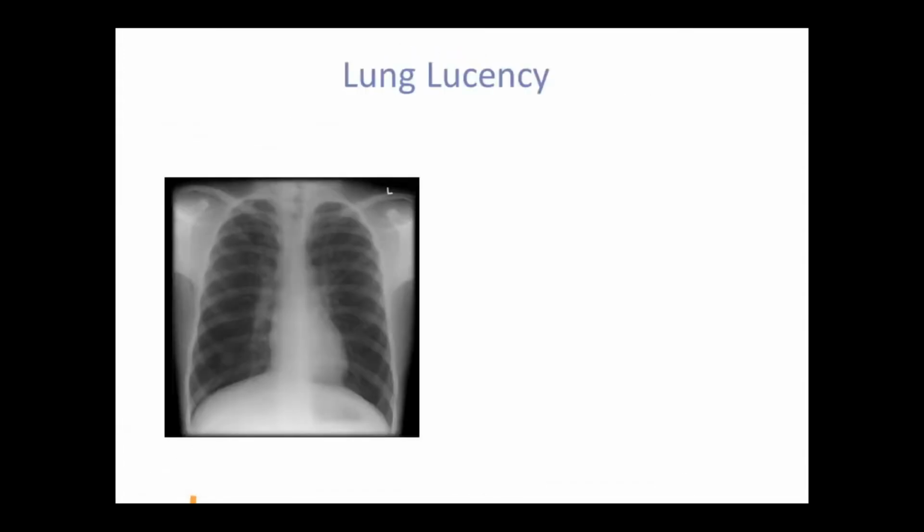Your preceptor asks you to see the next patient and tells you that they have a diagnosed medical condition. However, she wants to see if you can figure out what their medical condition is by looking at their chest X-ray. Looking at the X-ray, you note that the film may be a little bit underpenetrated as the vertebral bodies are invisible. At the same time, the lung fields also look darker than normal, and you wonder if there are any elements of over-penetration here.